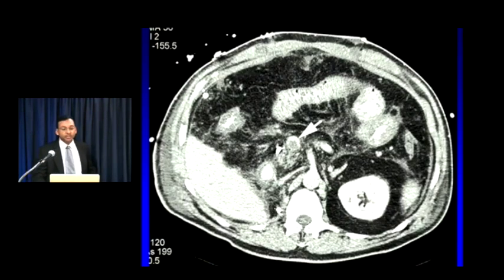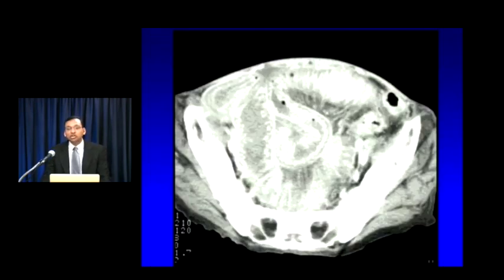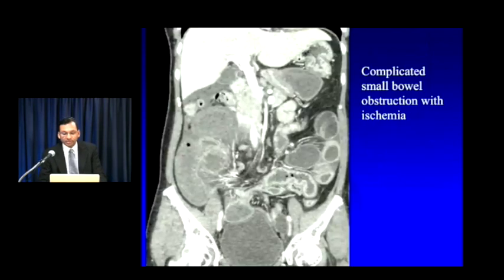Now, venous occlusions tend to be much more obvious, and the key here is not that you're going to miss the bowel findings, but that you don't miss the presence of clot in the SMV. In this case, horrible-looking bowel, lots of mesenteric edema, hemorrhage, and there's clot in the SMV. Here's another example. Again, dramatically thickened, dramatically hyperemic bowel in a patient with SMV thrombosis.